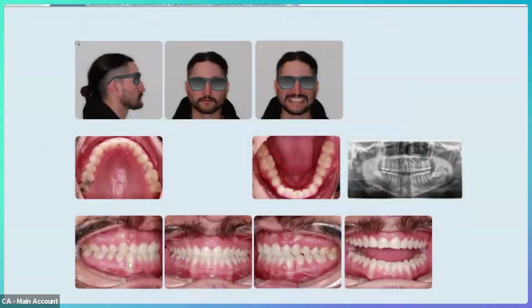Now, I'm actually just going to go ahead. I'm pulling up a different case entirely right now that I would then show as a tooth twin. So Matt, I want you to go ahead and take a look at this patient here. And this patient's biting edge to edge. So the Tupperware and the lid also don't fit together properly.